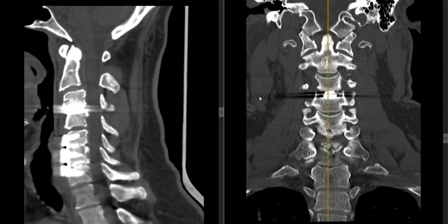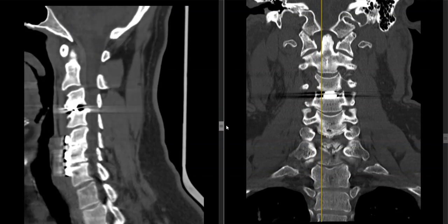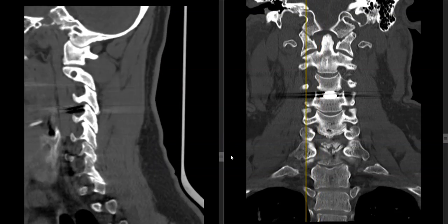So as you'll see, as I'm moving around here, this is where we're going to be looking. So this is your right side, so opposite. If you're looking at me, at the screen, right side's here, left side's here. So something that's common, and I think you and I have a similar problem. So you can see this facet joint here. This is C1, C2, C1, C2. So ignore the measurements actually. So you can see how these two line up right here.